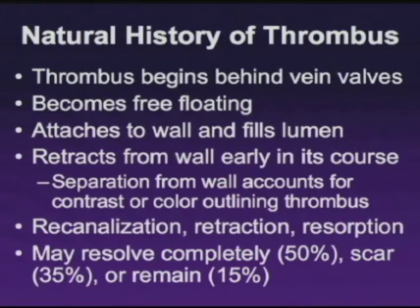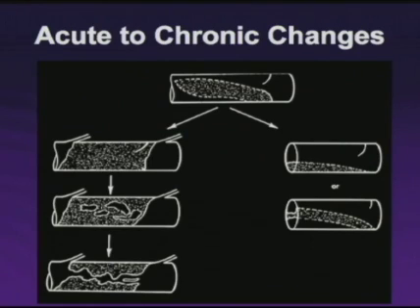And at several months, you may not see any evidence of the thrombus in the vein, or in about a third of patients see some scarring, or a filling defect completely filling the vein may be present in about 15% of patients. We can see a picture of this where we can see on the top the free-floating nature of the thrombus coming from behind the vein valve wall, and then to the left the vein completely fills with thrombus, and then the recanalization as the thrombus breaks down the middle.